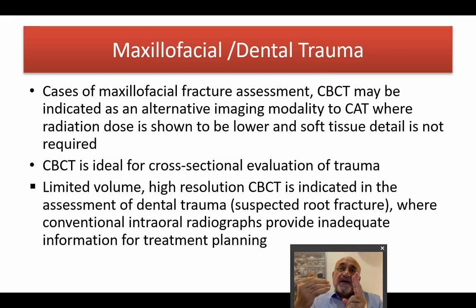So this is a normal procedure in cases of trauma, dental or whatever. Don't be satisfied with a single view.